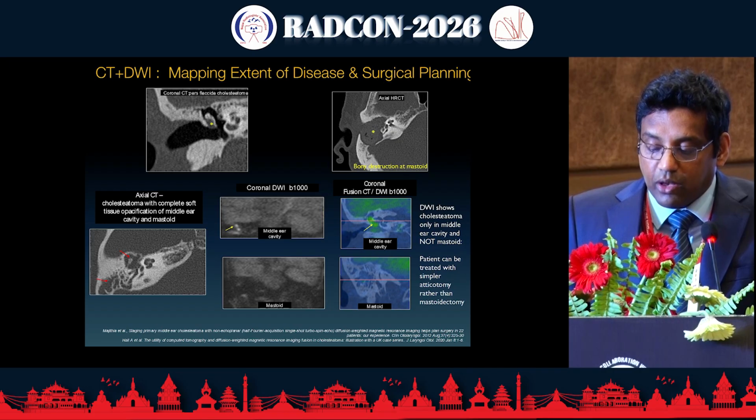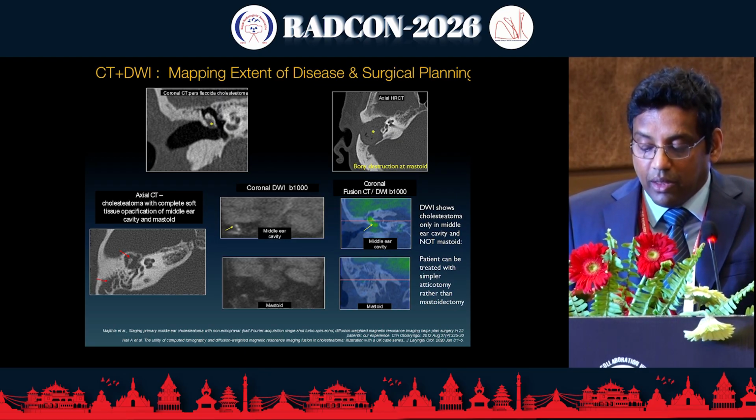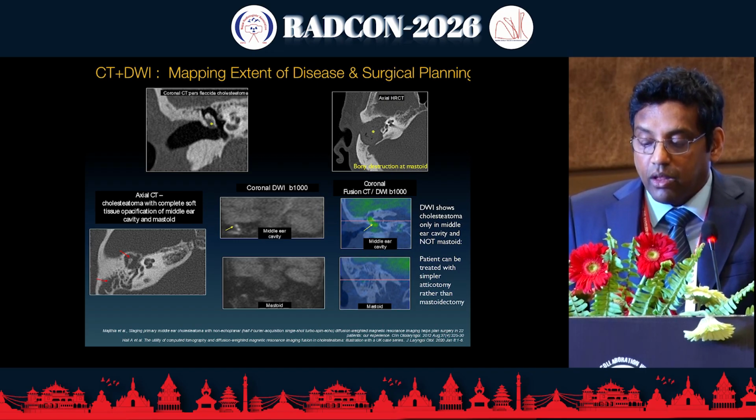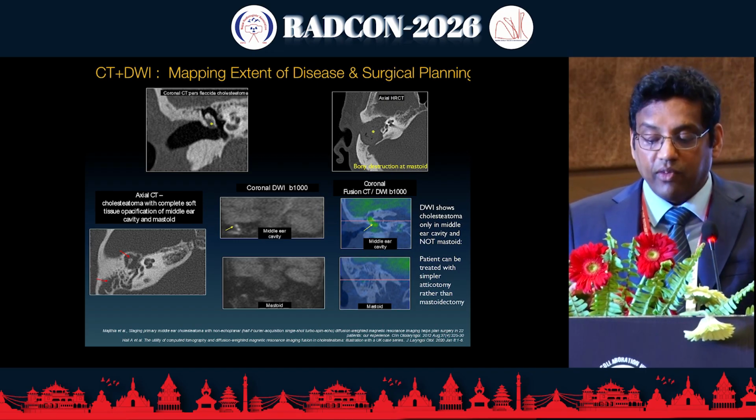You can see all the cholesteatoma, then you can't see the bone, and even on the coronal, you can see the cortical bone, that's gone as well, yeah? So that's another complication. So now we move on to extent of disease.